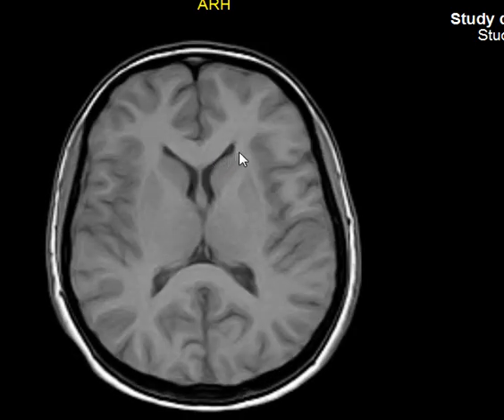So we are agreeing to the basics. We have axial, coronal, sagittal levels of imaging. We have T1 and T2 weighted images. These are the most basic images. Every MRI exam of everything in the body must have at least T1 and T2. There are other things. We'll not talk about it now. We'll stick with the T1 and the T2.